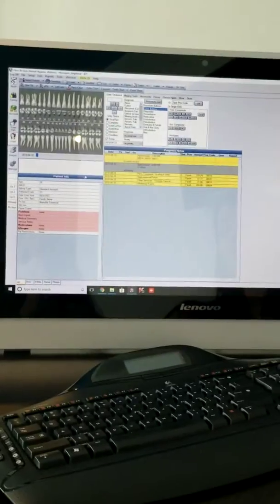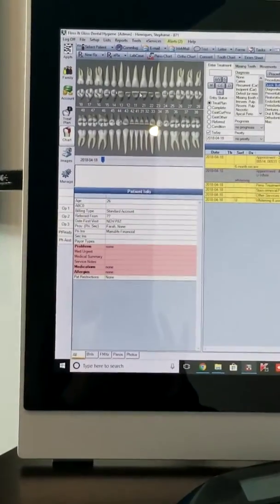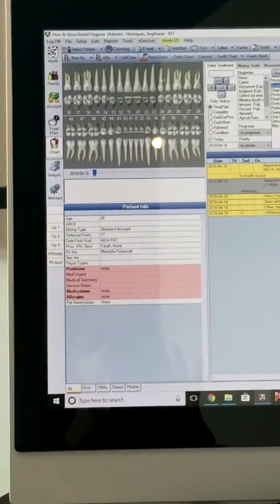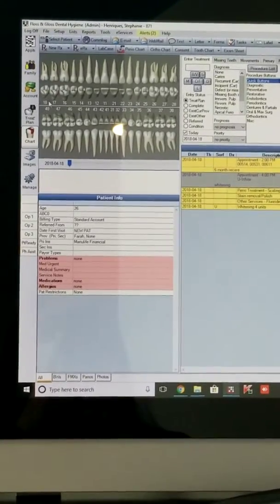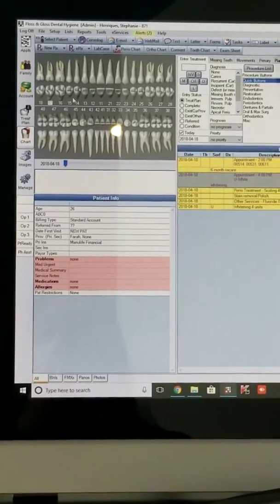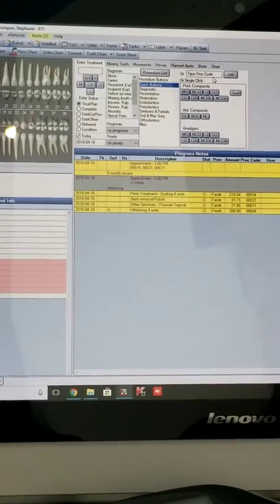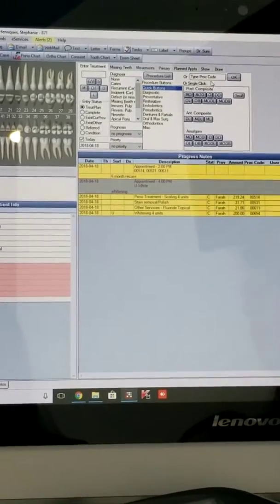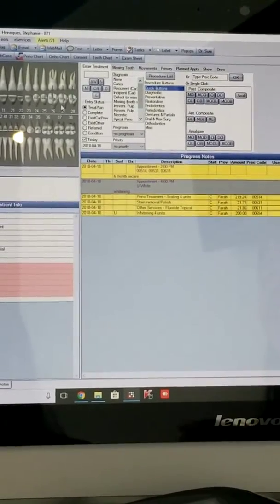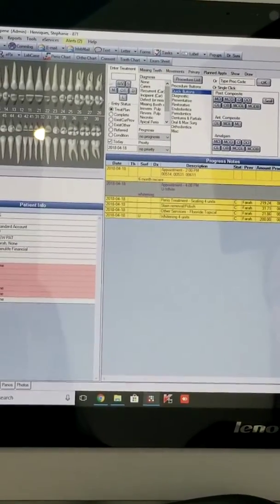And then do you chart fillings and stuff like that? Yes. So this is your odontogram for your teeth. Basically you're just clicking whatever tooth has something on it, and then you have to put in the corresponding dental code. Do you know the codes? No. Can't you just do resto, surfaces, occlusal? Look how it says there, post composite.